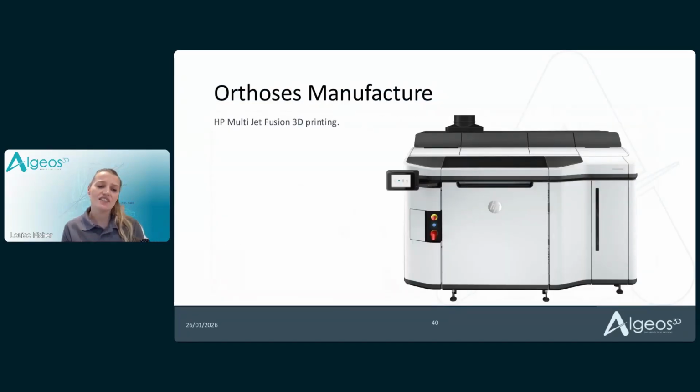And then the final stage, once you do the design, is obviously to send it off to print. Our Algeos 3D products are printed, as I said, with a PA11 shell, also known as nylon 11. And that is done using an HP Multi Jet Fusion 3D printer. If you're not aware of 3D printing, I'll make you aware right now that there are lots of different types of printers.